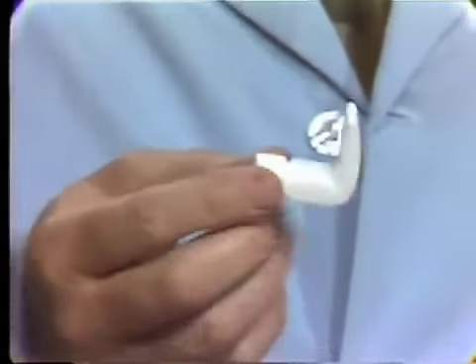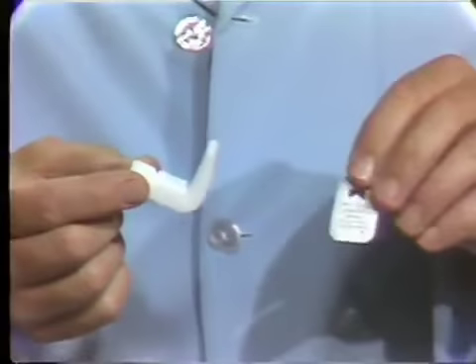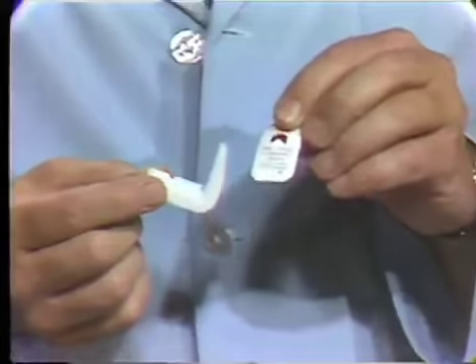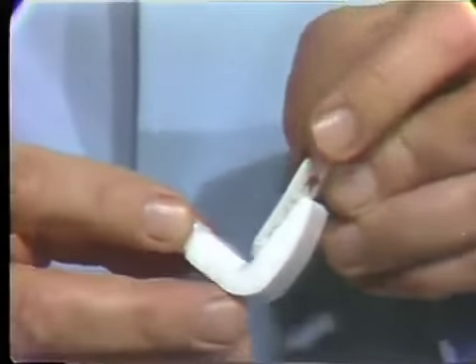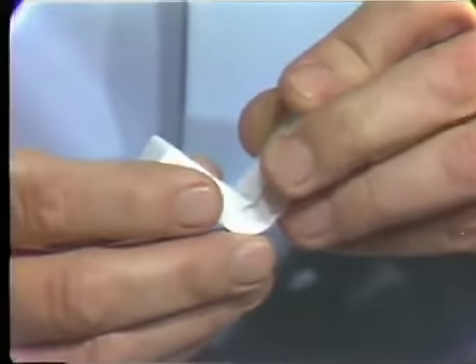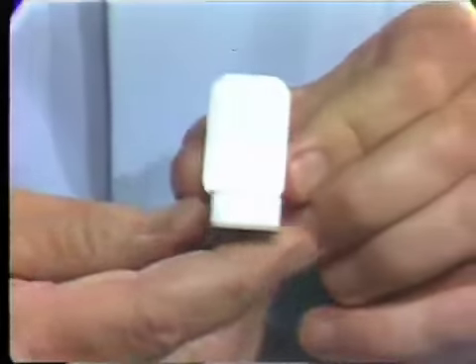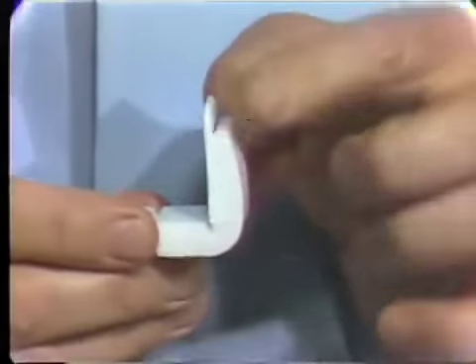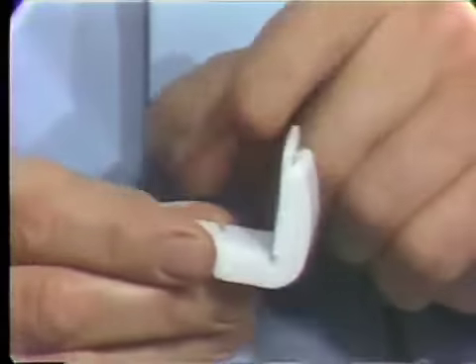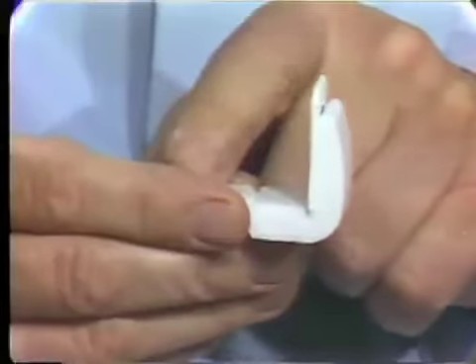I have in my hand here the foam plastic bite block, and I have a film packet. Now the film packet has a little black dot on the bottom. I'm going to insert the film packet into this slot so the black dot edge of the film goes down into this slot. So here we have the film in the bite block. It offers support almost to the top of the film. Forms a right angle between the surface of the film and the bite part of the block.